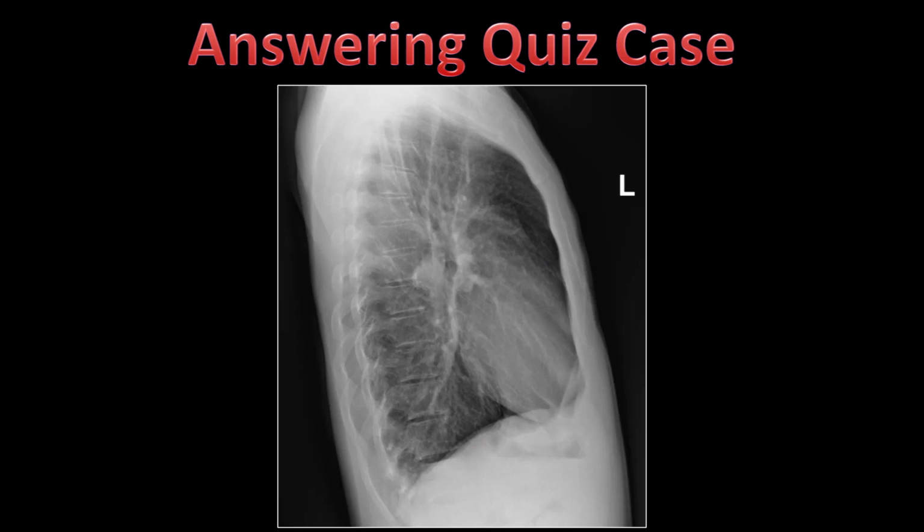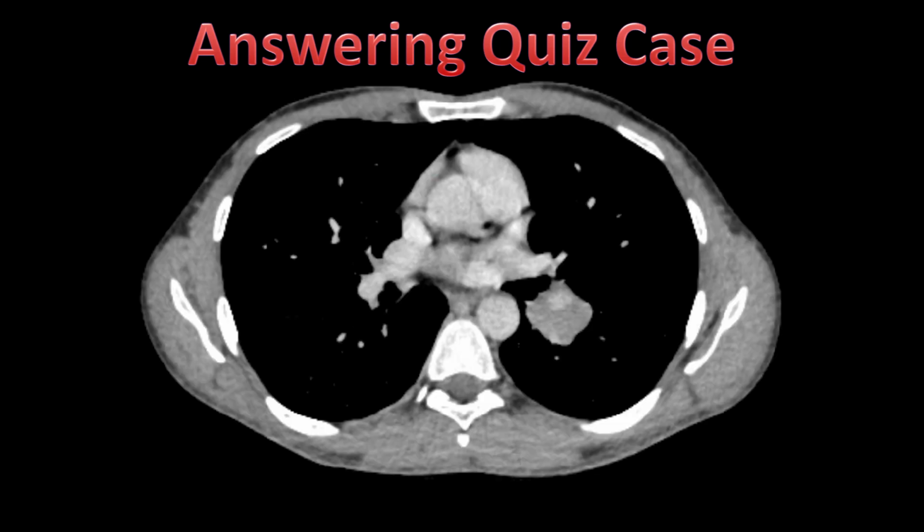then now you could utilize your knowledge of the lateral hilar anatomy. Looking at what we know, we understand that this is the trachea. Then you have a circle that seems to be surrounded by vessels. So we know this is the bad guy, the left upper lobe bronchus that is surrounded by vessels. This is the more rounded or oval, anteriorly located right pulmonary artery. And this is the more supposedly mini arch kind of left pulmonary artery, but it appears to be more dense and more bulging, which confirms the left hilar abnormality that you suspected on the frontal x-ray. Looking at the CT scan of the same patient, you could see that you actually correctly detected a lesion which was a primary lung cancer.